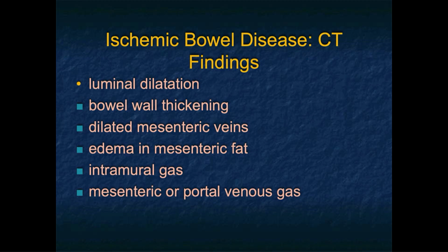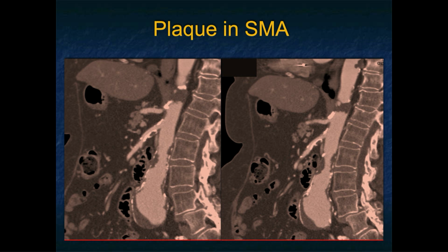One of the most common things is that people miss the presence of clot in a vessel. Now, people will scroll the images, and maybe you'll notice in an older patient significant atherosclerotic plaque at the origin of celiac and SMA, but people are typically scrolling the images. Sagittal views, we've published this years ago, are most critical for being able to look at the patient's SMA and celiac axis, in this case an aneurysm as well.